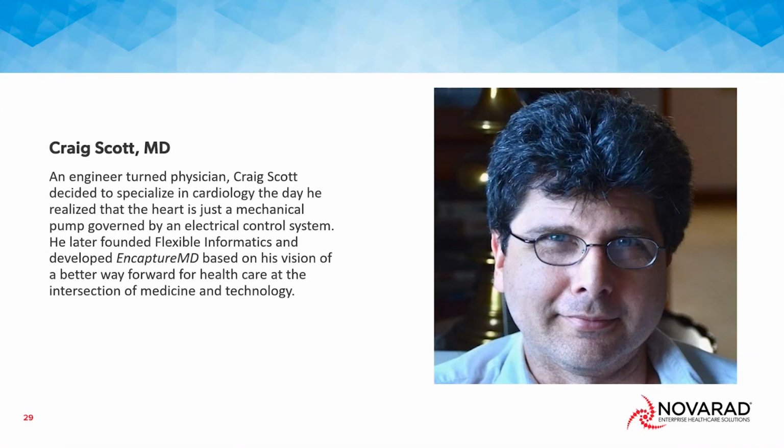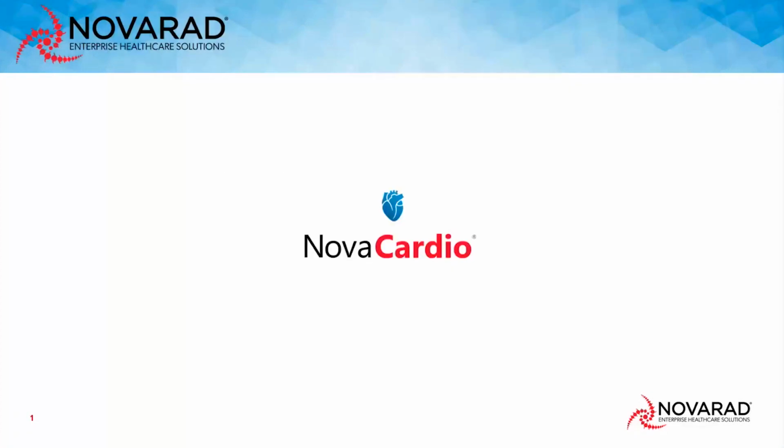Hey, good afternoon, everybody. This is Tony. I'm the applications team lead here. And today, let me share my screen. We'll be covering the NovaCardio. I'll just be covering the parts that you see in NovaPax, and then at some point I'll hand it off to the Encapture MD team, because theirs is the one that's actually creating the reports. It's probably the part that you really want to see.